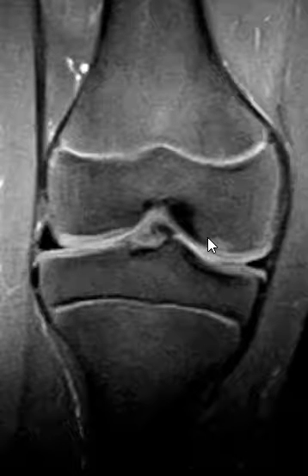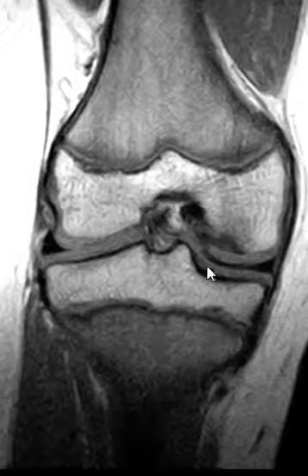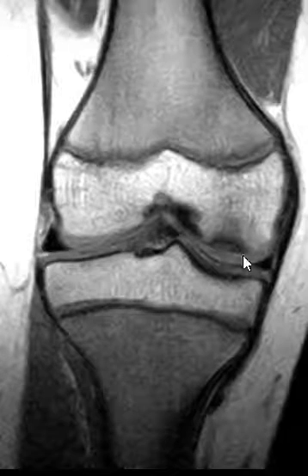Now, if you see fluid going between the osteochondral defect and the bone, that can be a sign of loosening. And then the next thing is displacement. But again, there's no well-defined band of fluid. There's no displaced bone fragment. So this is a pretty good prognosis, especially in a young person like this. Again, it's very shallow, no loosening, no displacement, no significant perilesional edema.